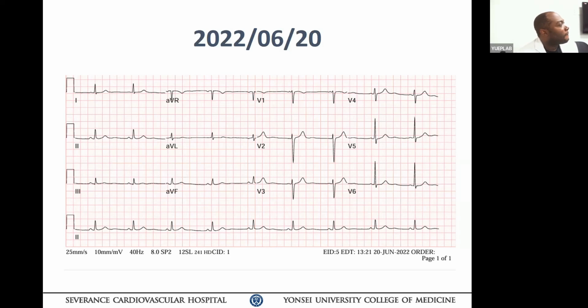Based on the QRS morphology, I can only find one kind of QRS morphology, so it seems like it is normal. Okay. 2 fellows interpret as normal.